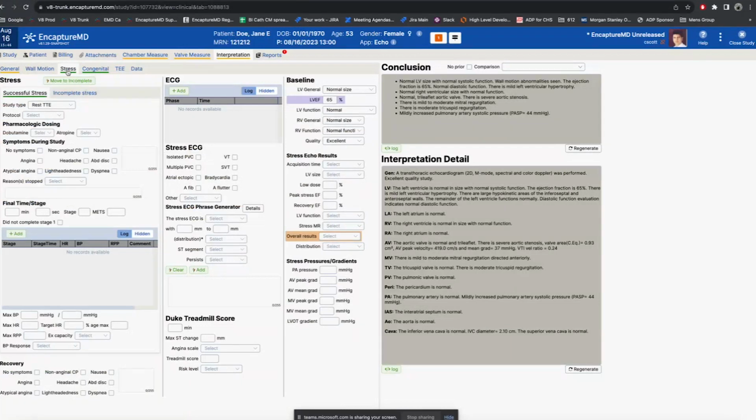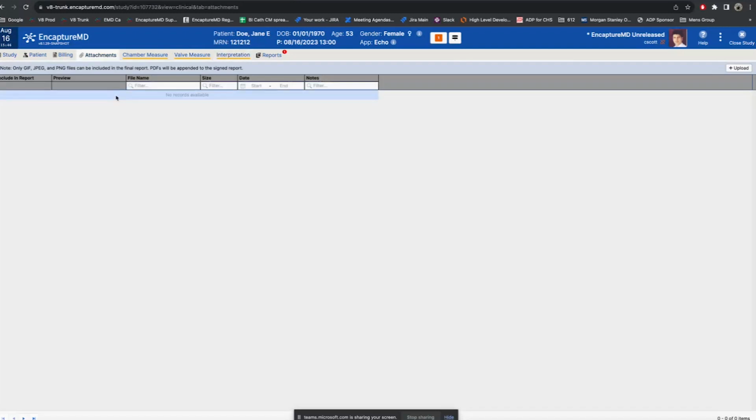If you have a relatively recent vintage stress treadmill machine, we can pull the data in here and fill that out automatically. The doctor can do his electrocardiogram interpretation here. We can pull a PDF of the electrocardiogram done on the study, put it here in the attachments tab, so the doc doesn't have to worry about paper. It'll all be right here.